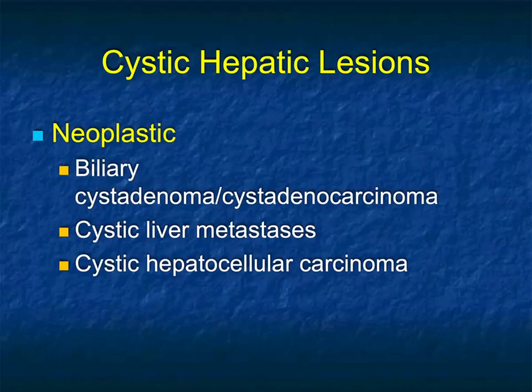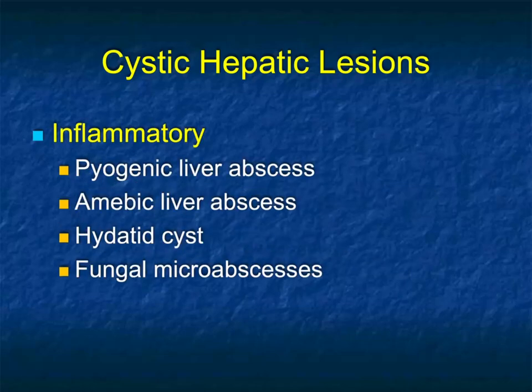We'll talk about cystic liver mets. Classically, cystic liver mets occur in patients with ovarian cancer, patients with GIST tumors, and perhaps patients with melanoma. And of course, hepatoma can be very cystic. In part, it looks like it's necrotic, but cystic and necrotic in the face of hepatoma tend to overlap, of course.